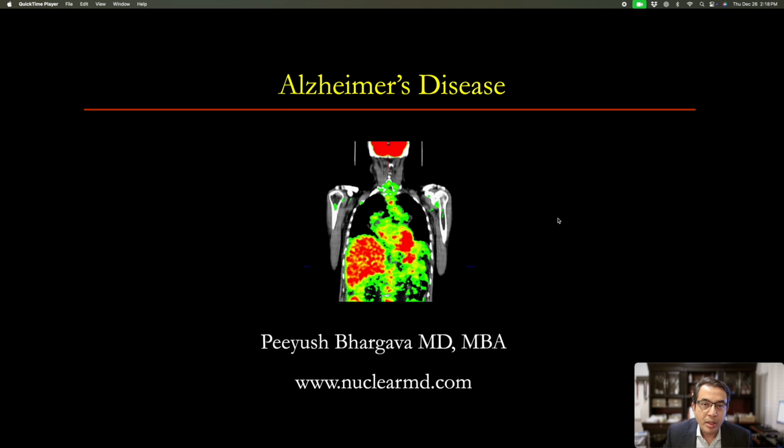Hi, this is Dr. Bhargava, and in this short video, I'm going to share FDG PET-CT studies in patients who have Alzheimer's disease, how to do the interpretation, and what are the findings on amyloid or F18 florbetapir scans in patients who have Alzheimer's disease.